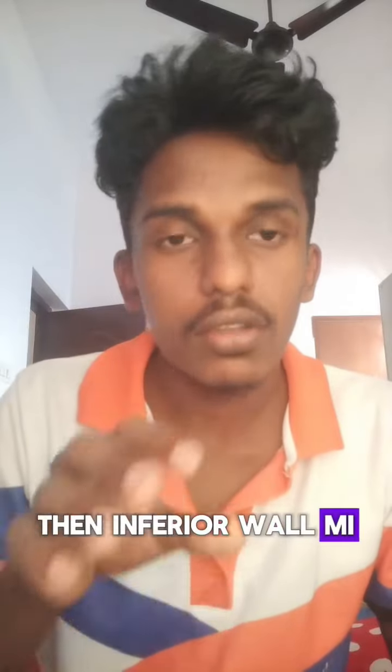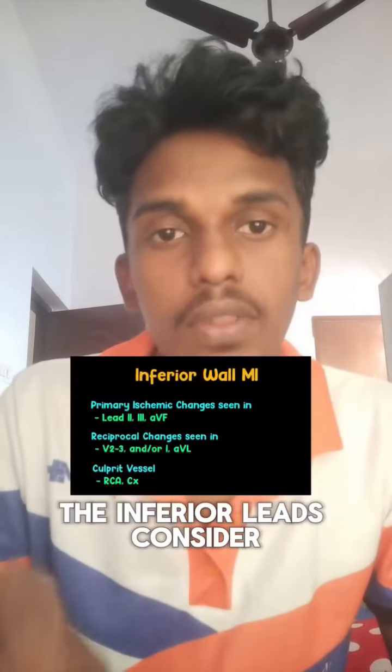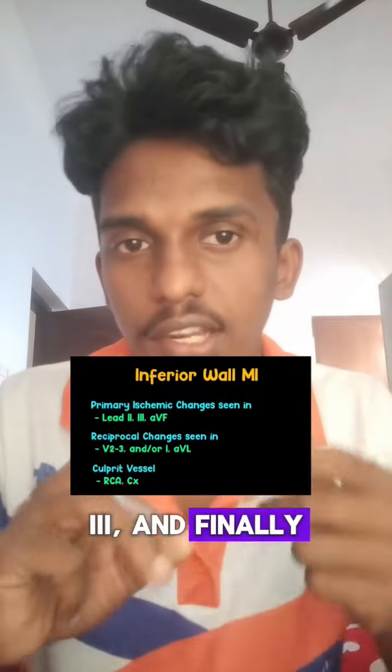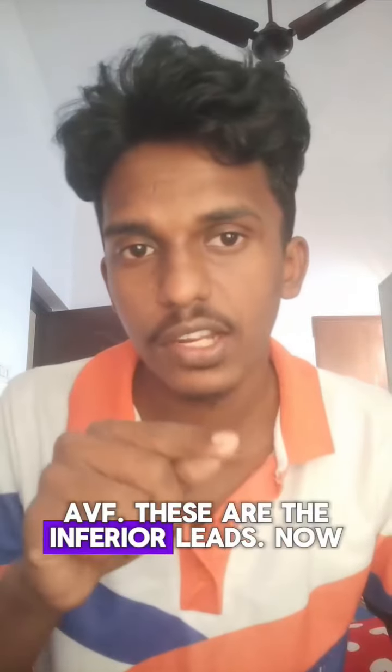Then inferior wall MI. For inferior wall MI, the inferior leads. Consider I as the Roman letter 1. So continuation of that, 2, 3, and finally there is AVF. These are the inferior leads.